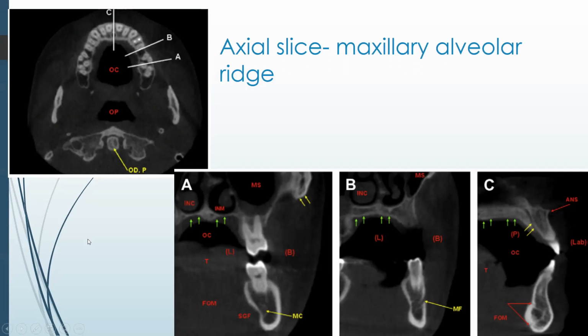So this is just a brush up of anatomy. If you need it, we will give it. Otherwise it's not needed. If you are well versed, then we will stop it. But here at the level of the maxillary incisors, you can see the nasopalatine canal over here. And here you can see the various foramina, the lingual foramina.